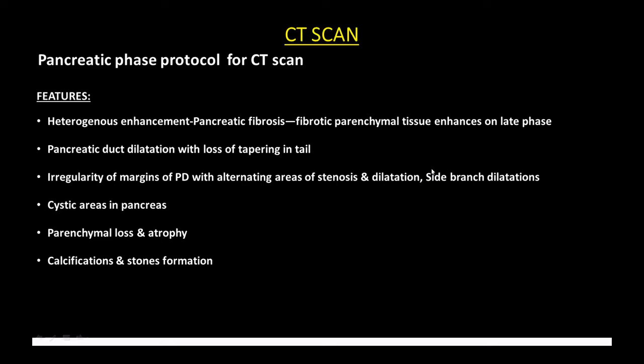The calcification and stone formation come later in the phase when the ductal drainage is severely impaired, proteinaceous material gets precipitated, and calcification and stone formation start within the parenchyma. And during all this process, there is severe parenchymal loss and atrophy of the parenchyma. But if we are seeing calcifications and stones within the pancreatic parenchyma, we are dealing with a case which is severe in nature, as well as it must have a very long duration.